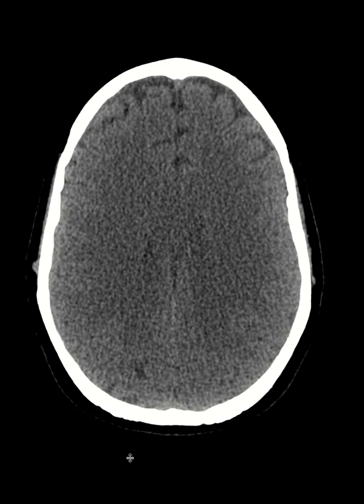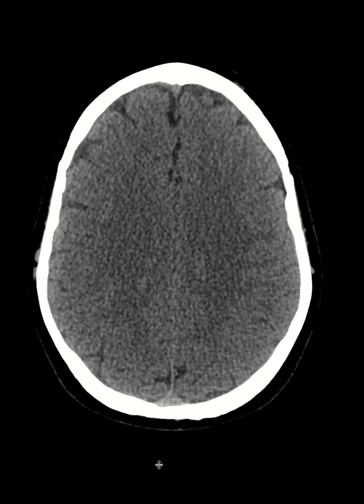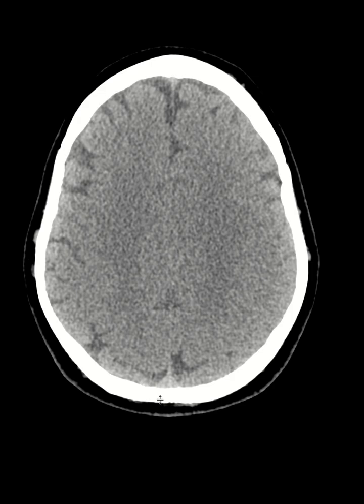Today I would like to discuss a very interesting entity, actually specific manifestations on CT. I think one of the advantages we as radiologists have is that we see the patient and the whole spectrum of different entities that my patient has besides what the clinician thinks, because every imaging pattern just shows a specific diagnosis. So I just want to show an example.